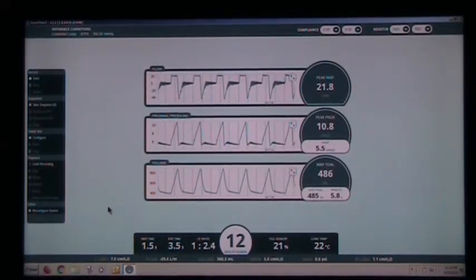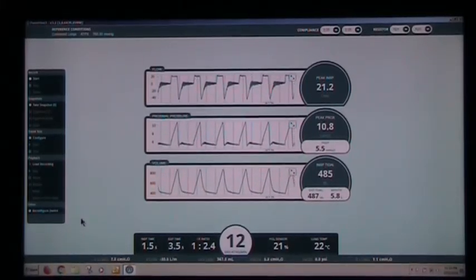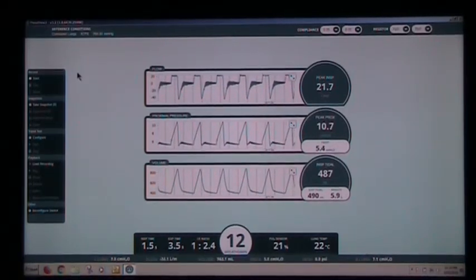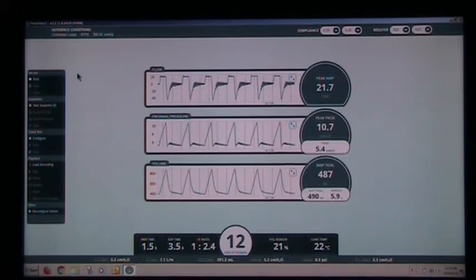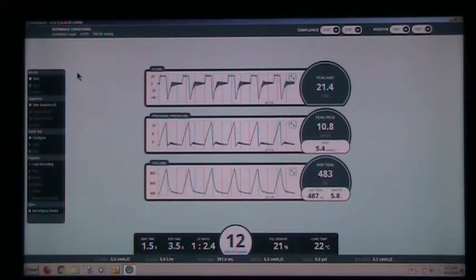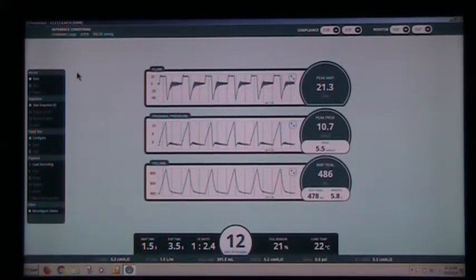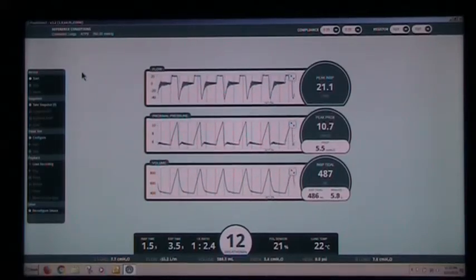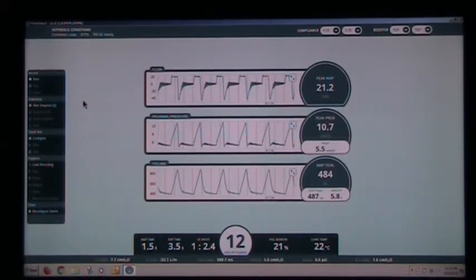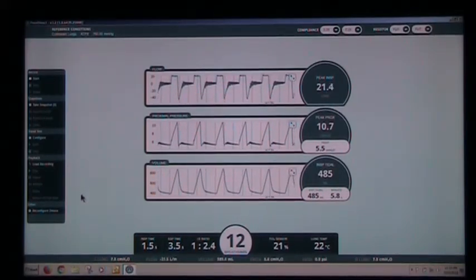Lastly, and very importantly, over on the left-hand side of the screen, you have your mode selection menu. Now we're going to get more in depth into the mode selections, but there are basically 5 modes of operation in PneuView. There's the active acquisition mode, which is open and happening as we speak. But you're also able to record this data, replay the data, grab the numeric values, or actually run a trend test. And those are all available over here on the left side in the mode selection menu.